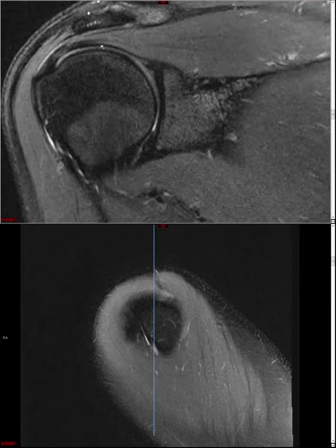So we look at the articular surface fibers, and if they're smooth and they're intact, then you're actually dealing with a high-grade partial thickness bursal surface tear of supraspinatus rather than a full thickness cuff tear. And the reason why this doesn't show on the sag is because the footprint has a medial lateral width to it. So you could conceivably have a partial thickness bursal surface tear.